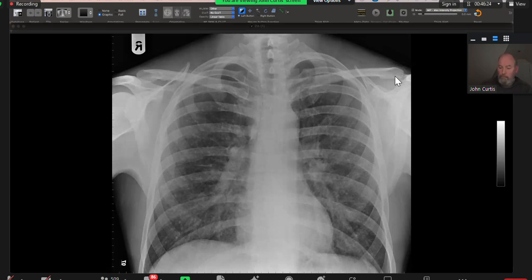It could be due to atypical infection, atypical pneumonia. Which one? Klebsiella pneumonia, maybe. No, that gives you a lobar pneumonia with a bulging fissure. This is miliary TB. Miliary TB, yeah. So in the exam, you must say miliary TB.